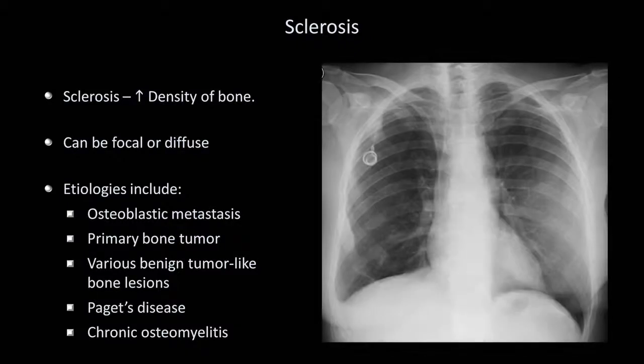Here's an example of a patient with some sclerotic rib lesions. Look closely for them. Don't worry if you can't see them. They're very subtle. In this case, two of the patient's anterolateral ribs appear focally thicker and denser than they should, even when accounting for the superimposed shadows from some of the posterior ones behind them.